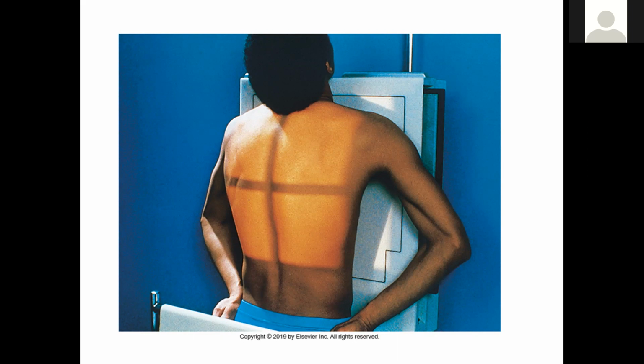If your patient's injury is in the front, put that injured part against the bucky. You'll get better detail on those ribs. If their injury is on the back, turn them around. Have their back against the bucky, both for your upper ribs and your oblique projections.